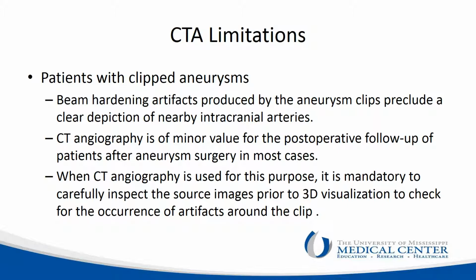In patients who have had aneurysms clipped previously or coiled, beam hardening artifact will make it difficult to visualize the nearby structures. In postoperative cases, CTA really is not very useful, and MRA with and without contrast would be a better way to evaluate those aneurysms.